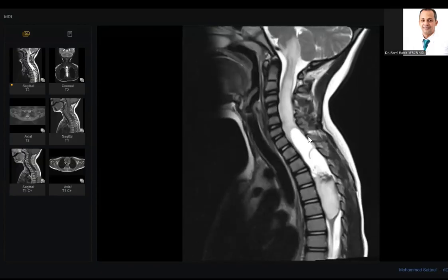Now in the FRCR, they start to introduce them. I think two young candidates have been presented with spine cases. It is not difficult, but we are not familiar with it. If this teratoma ruptured, you may find some fat in the brain, so the patient may present with severe headache.